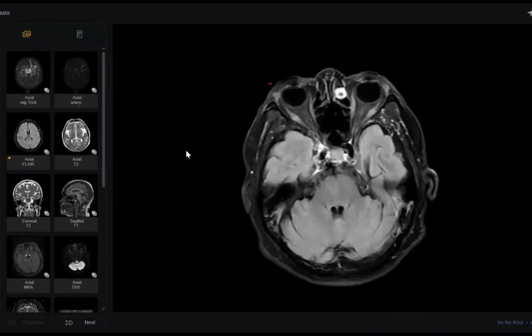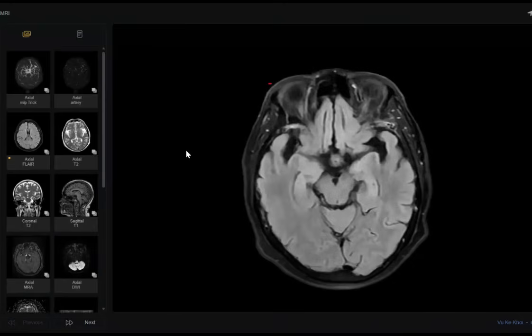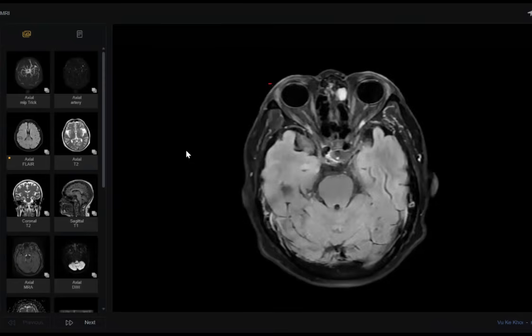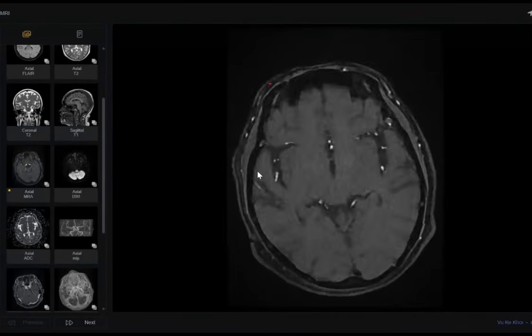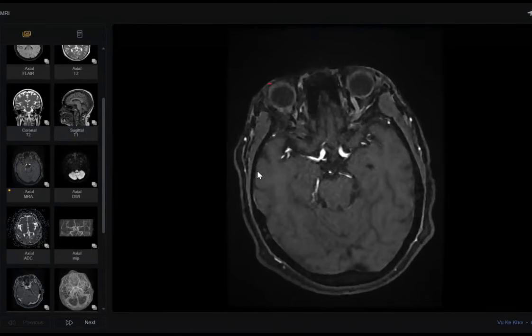Look here. If you go slice by slice, you can get it, I think. At least it is difficult here. At least when you see the MRA like this, one of your review areas is to check the post-orbit. Go one by one.